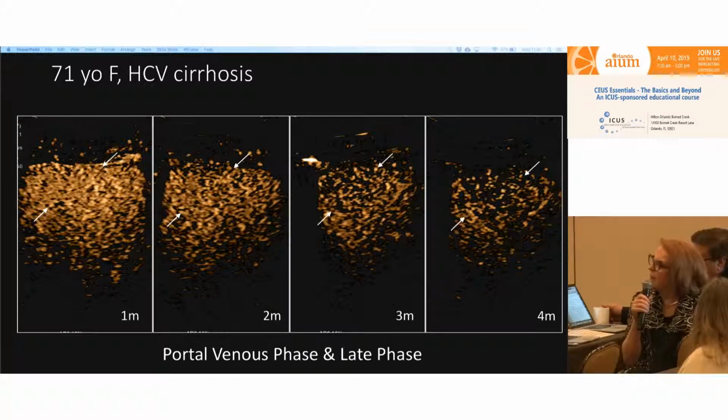Now, the thing, unfortunately, though, is some livers are so poor, like if you were in a real screening program where patients have been around, they've had previous treatments, that even when you try that, the perfusion of the liver can still be down. But I totally am supportive of doing that. So you just inject and you wait, and then you peak on the portal venous phase, and you've got to make sure you're in the right place.